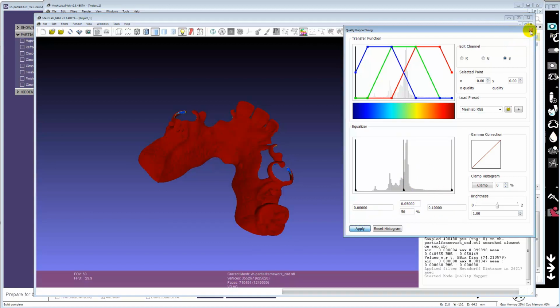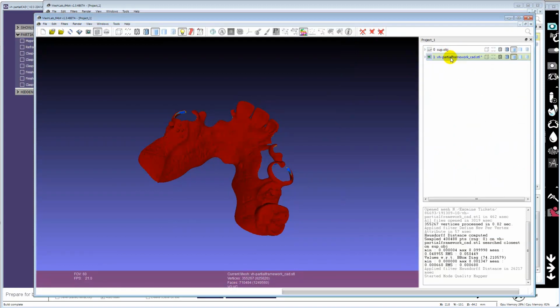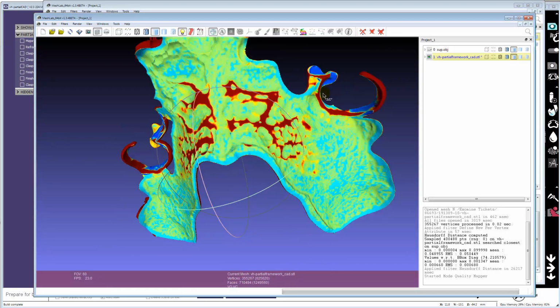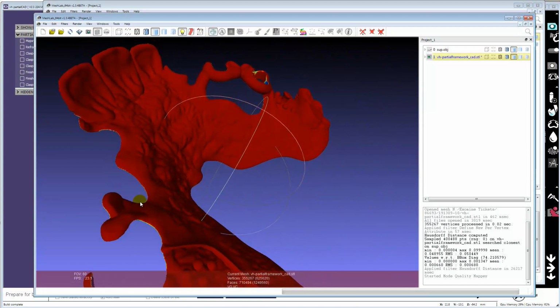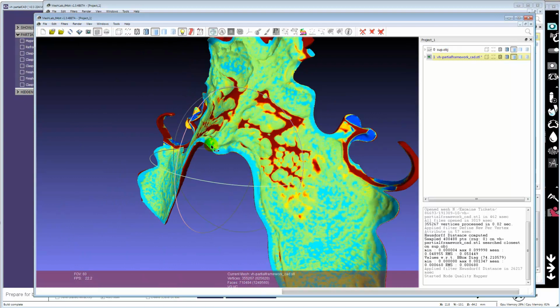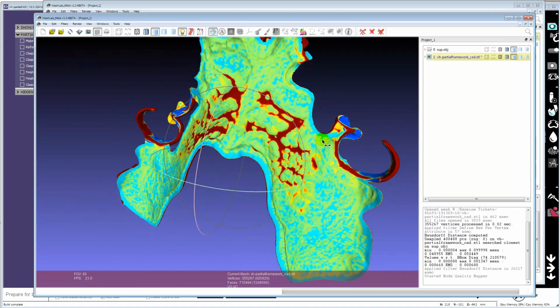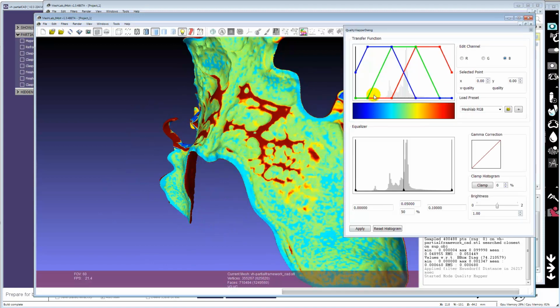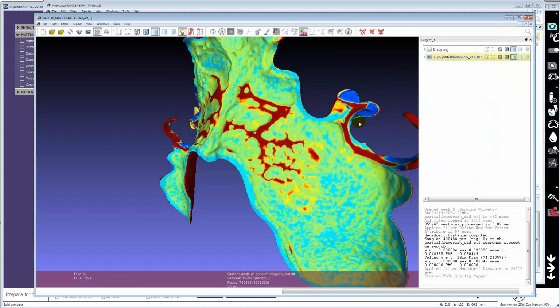You apply this, and sometimes you have to click on this again. I don't know why that is, but okay. You flip it over, so you see that this looks more reasonable for an offset. And also, I applied the modifications to this clasp rest. I didn't change that one, so you can see this is the old one. This is the one I actually changed, and now you see it's light blue, which is probably these values here. So this corresponds to the 20 microns for the typical clasp offset.